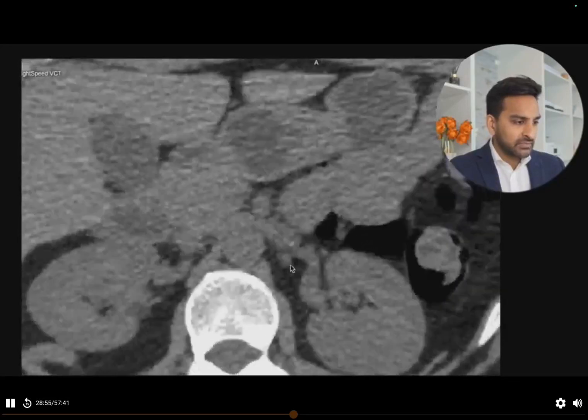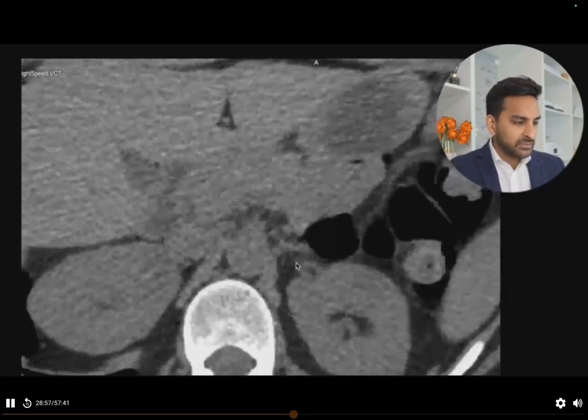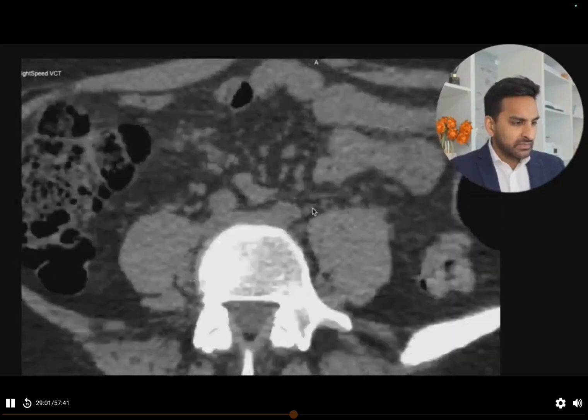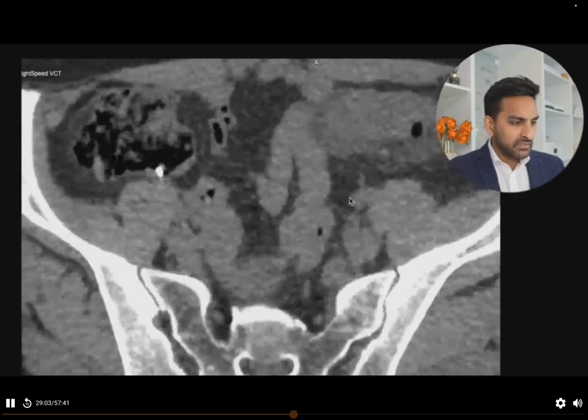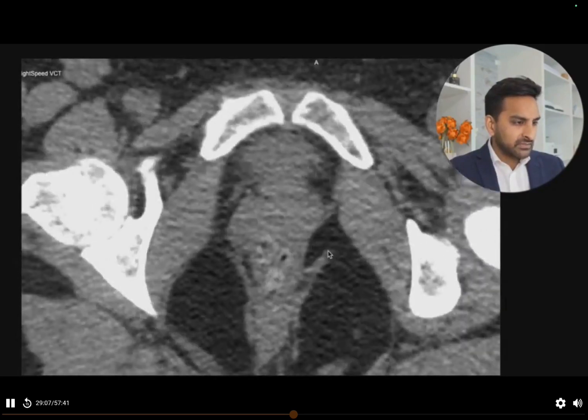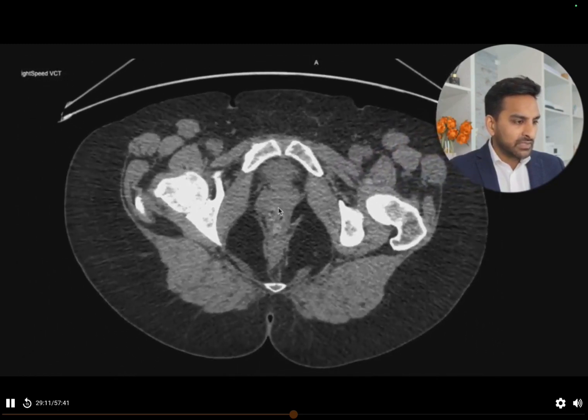Possible they've got a renal calculus that is causing their trouble. Right, so let's go down, follow that ureter, follow that ureter, follow that ureter. And actually, it doesn't look like there's any calculus located within the region of the ureter either. So we've got to go back to square one, I guess, and try and figure out what's causing this person's trouble in the first place.